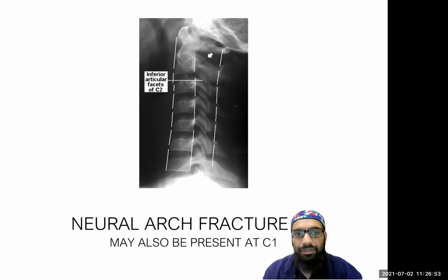And the way that we do that is by looking at these three lines that I'm now going to demonstrate to you. When you learn it in radiology and orthopedics, they talk about 5 lines, but we talk about 3. The 3 that guide us are these. The anterior line, which forms along the anterior vertebral body. The middle line, which is the back of the vertebral body, and then the third line, which is the back of the spinous process. So these are the 3 that guide us.